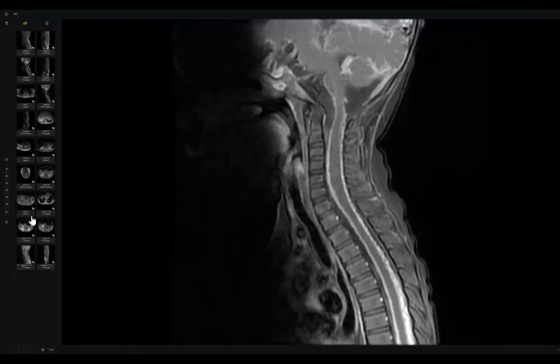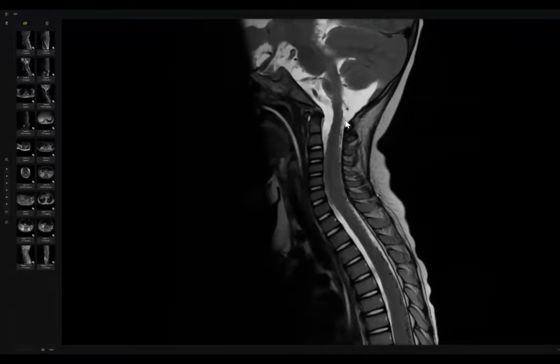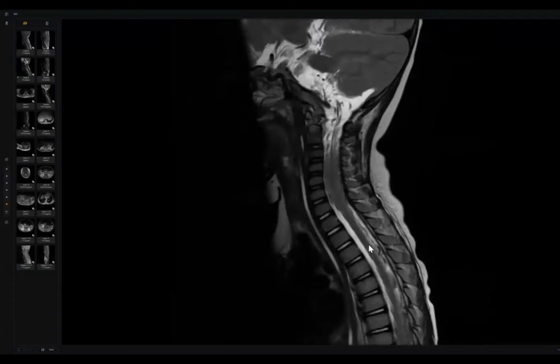Do you think this could be the pial enhancement that you're showing? Yes, this is directly upon the cord, the medullary surface, the cord surface. The pia mater looks like really some maybe some vascularity.